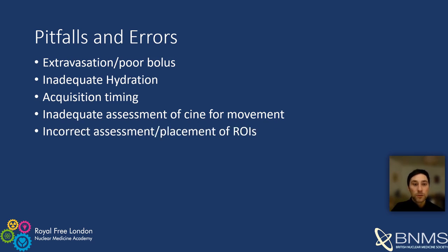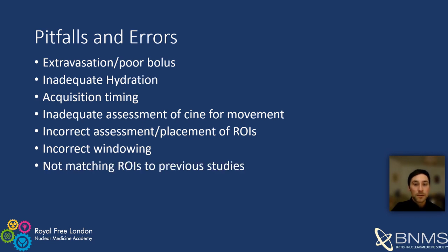Check that the ROIs correspond to the correct kidneys. Are the blood and tissue backgrounds optimal? Incorrect windowing can lead to incorrect interpretation. Not matching ROIs to previous studies could result in incorrect comparison.